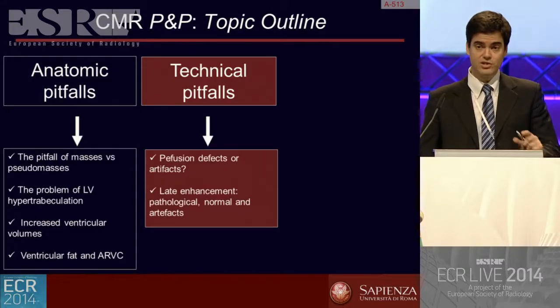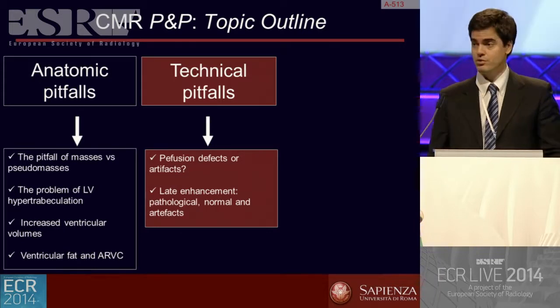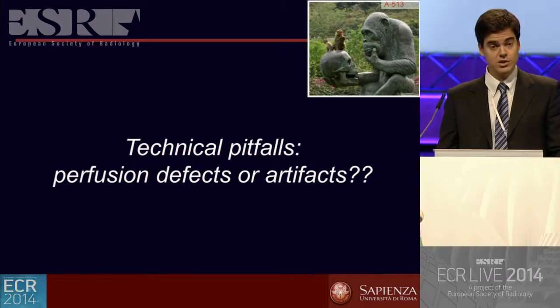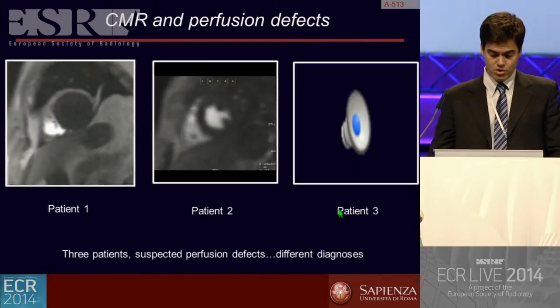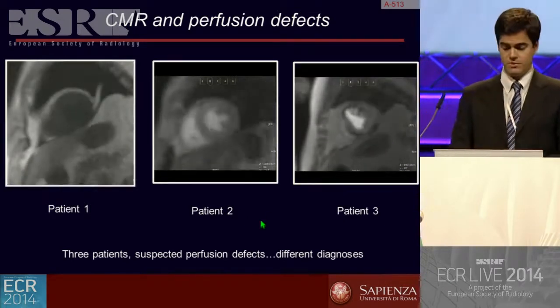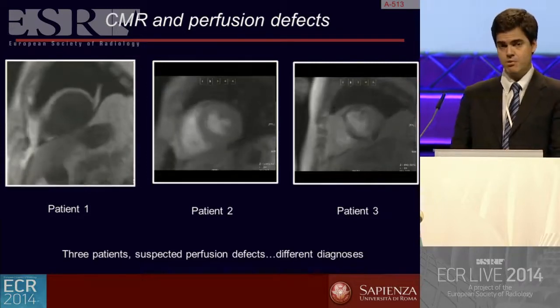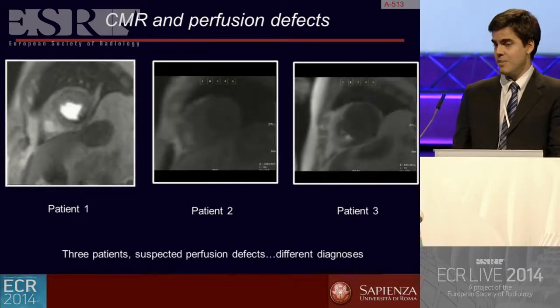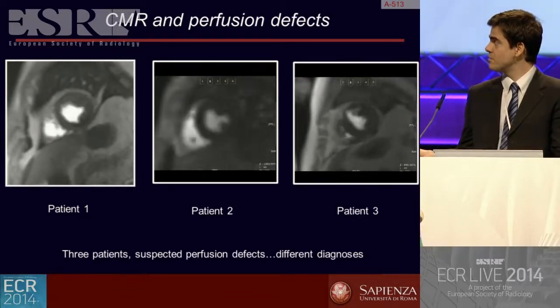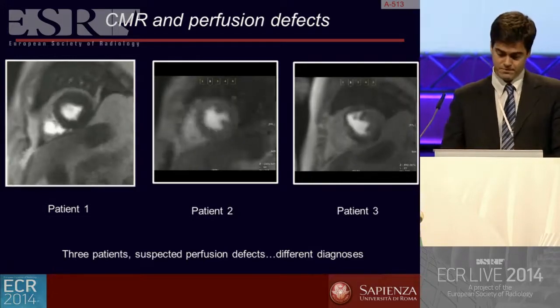In this case, I would like to discuss with you two major points. First of all, the perfusion defects, and second, to focus on late enhancement. So, perfusion defects or artifacts. We have 3 patients, completely different stories. In all cases, our residents gave perfusion defects. Patient number 1, patient number 2, look at the lateral wall here, and patient number 3.